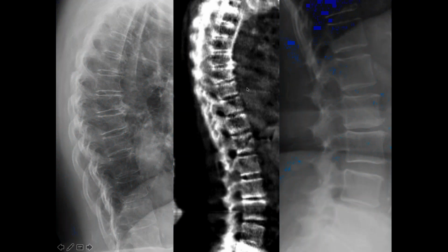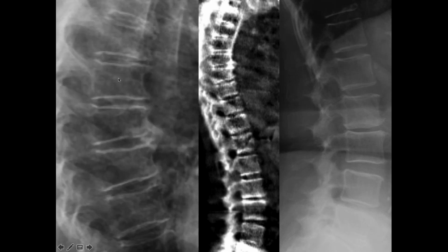Now we'll compare. We can see that we have two vertebrae here that have wedge deformity. It becomes somewhat easier on the radiograph to judge the integrity of the end plates. Here we can see that there is some bowing deformity of the end plate and perhaps a slight break in this one. So that would indicate that these are likely, in fact, fractures, although they probably are of some considerable duration because of the amount of degenerative disease around this area where the biomechanics has been altered.